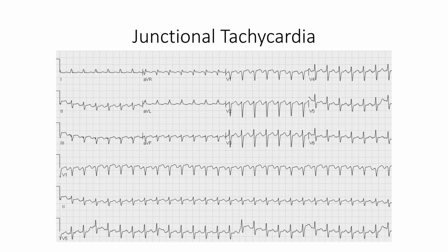Here's another ECG that you'll often see in sick patients that have compromised conduction across the AV node. In this first ECG, you can appreciate that you have a rapid rhythm with a narrow QRS. And I don't know about you, but I can't really see a good P wave here. The reason why we can't see a good P wave is that the electrical signal is coming from the cardiac crux, the middle of the heart, where the mitral and tricuspid valves meet the septum. Just inside and below this junction is where junctional tachycardia comes from, right in the center of the heart.